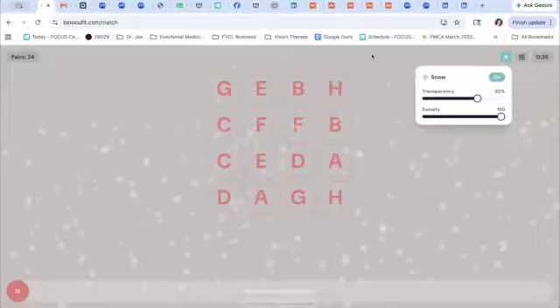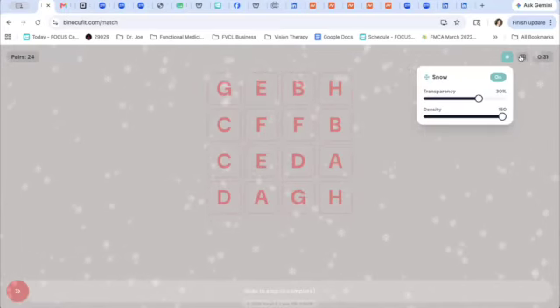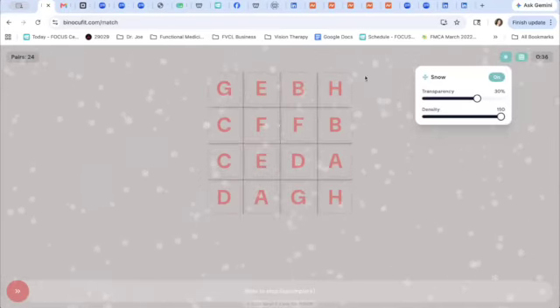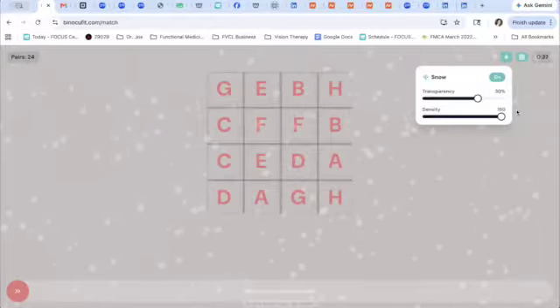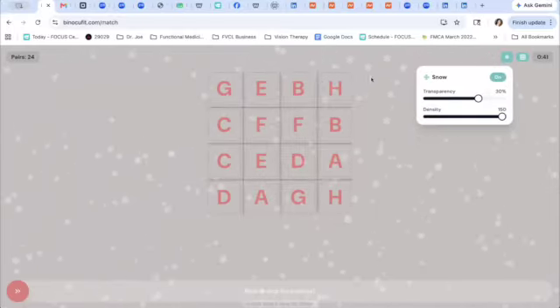The stability grid might not be as necessary if you're training in this MFBF type mode, but in the red-green mode, the stability grid definitely comes in handy, which is just a grid that you can change the thickness of that is seen by both eyes, just to help create that stability there.